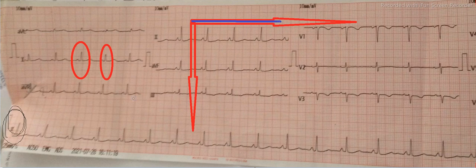Now let me take another example, and draw with brown color. So AVF, where is our AVF? You see here in AVF, let me draw with a circle, in AVF also the QRS complex is positive. So when you draw its vector, this is your origin line, it is positive, it means the vector is directed towards the arrowhead. And if you compare the magnitude of the QRS complex in lead 1 and AVF, lead 1 is slightly less than AVF, so we will extend it a little bit lower, and this will be the vector representation in lead AVF.